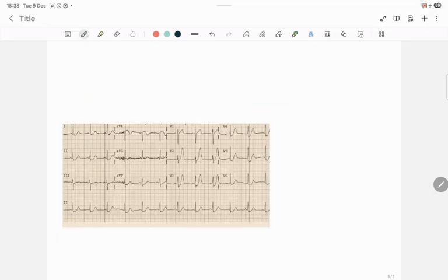And what you will find is that there's an ST depression in V2, V3. You could see there's not so much ST depression in V1. I usually ask people to use a ruler, to put a ruler across their J points to see if indeed there's an ST depression.